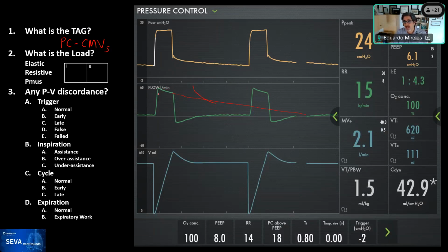So I could see how you're looking at this and saying, well, it's not decaying like this. So all of this may be that the patient is doing effort, and it could be. It certainly could be. Although there are some things that tell you that this is not as much effort, which is the pressure did not have any change, neither here nor here.